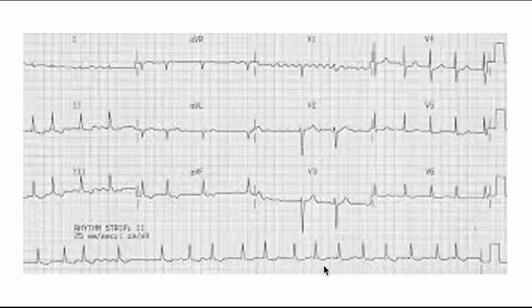So starting here, these first two EKGs are literally just terrible quality, but what I want you to look at is V1. Now, if you don't see a P wave before every QRS, or if these beats look irregular and abnormal, you can always confirm atrial fibrillation by looking at lead V1. I don't know why, but it's always the most consistent.